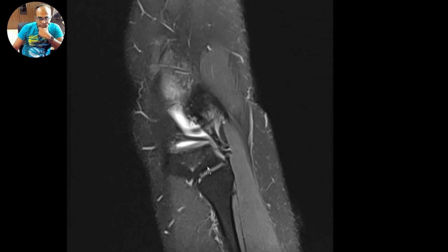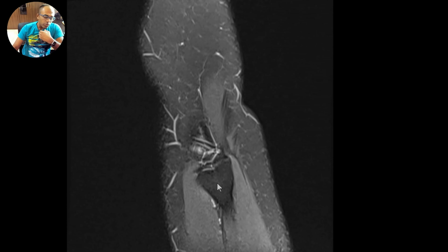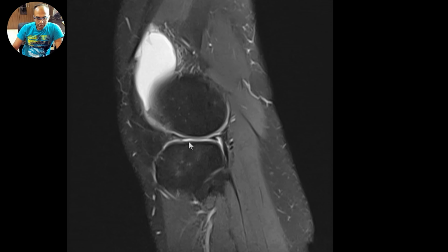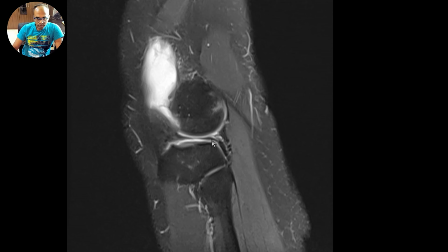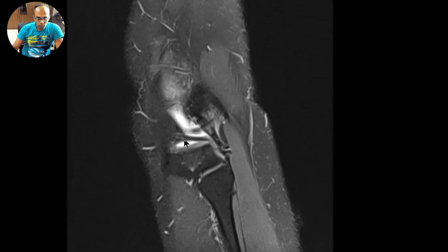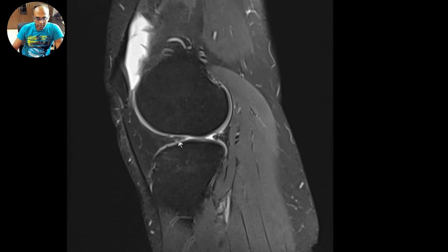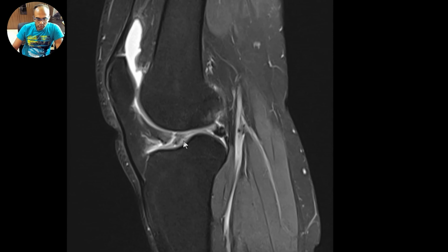Now, as I go further, I prefer to go completely towards the lateral edge of the lateral meniscus and then scroll back inwards into the joint. So let's begin and start looking at the lateral meniscus. It looks like right from the beginning there is a reduction in the volume of the anterior and posterior horns of the lateral meniscus. As I come closer towards the roots, they appear fairly intact and fairly normal in volume.